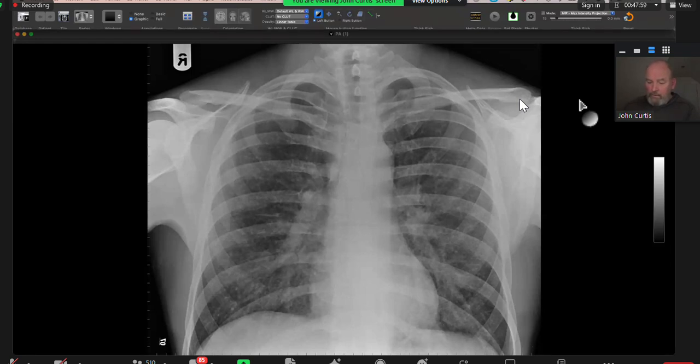Yes, I have been presented with a frontal chest radiograph for an adult male patient with history of febrile and sick. I cannot detect any obvious abnormality, so I will go through my checklist. I can see that there are tiny nodules scattered through both lung fields. I cannot see any mass lesions. I can see that the costophrenic angles appear clear. I can see that there is opacity seen in the left hilar area.